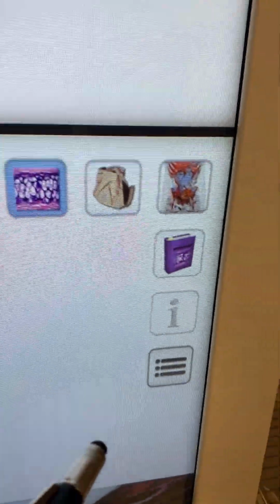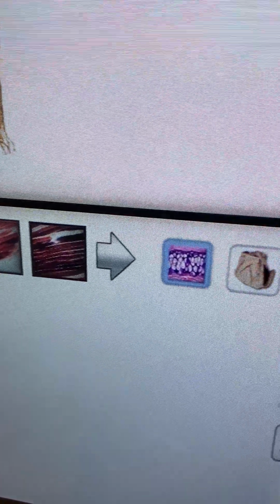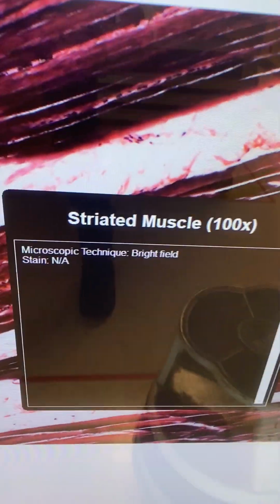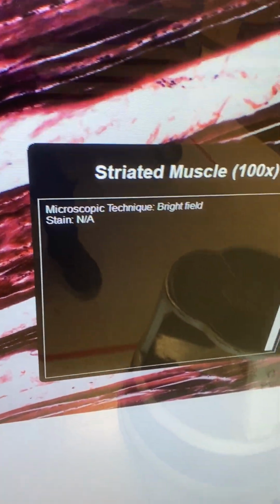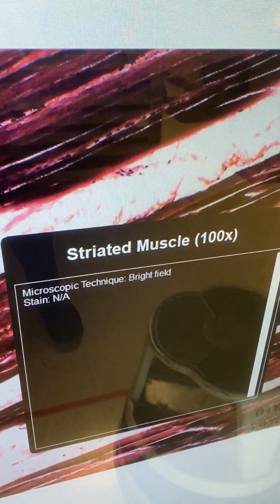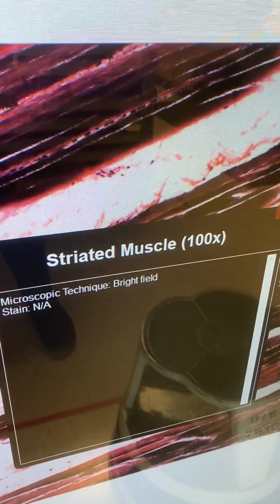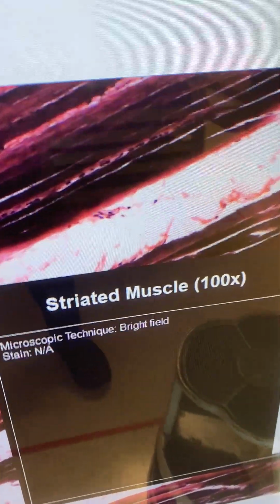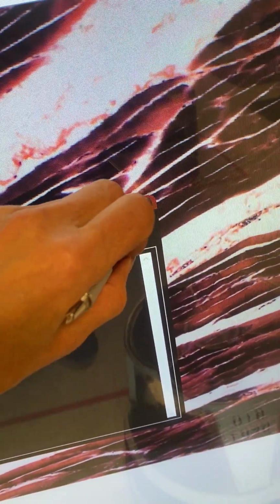If you tap on the eye section here, a screen comes up showing the information, annotation, and magnification of the scan, and I'm closing this one here.